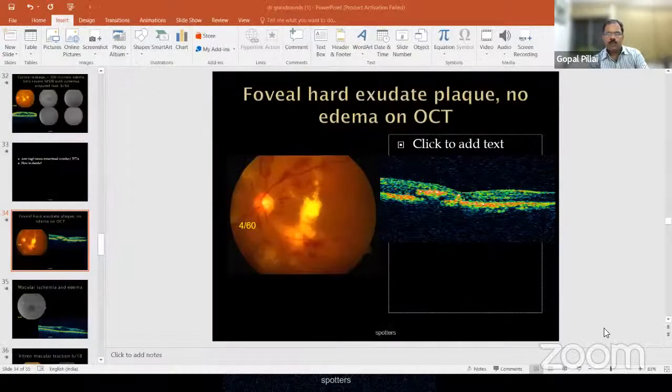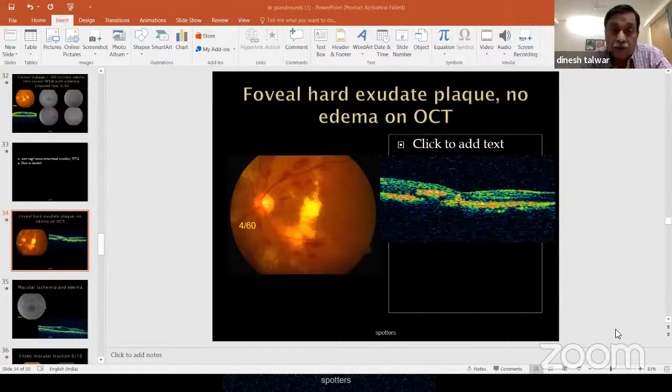cysts? Cysts mean that there is more chronic factor, and large cysts are a poorer prognosis. Can you go back for a moment? Yeah. Not this one, no. It was another one. Just get back to that.